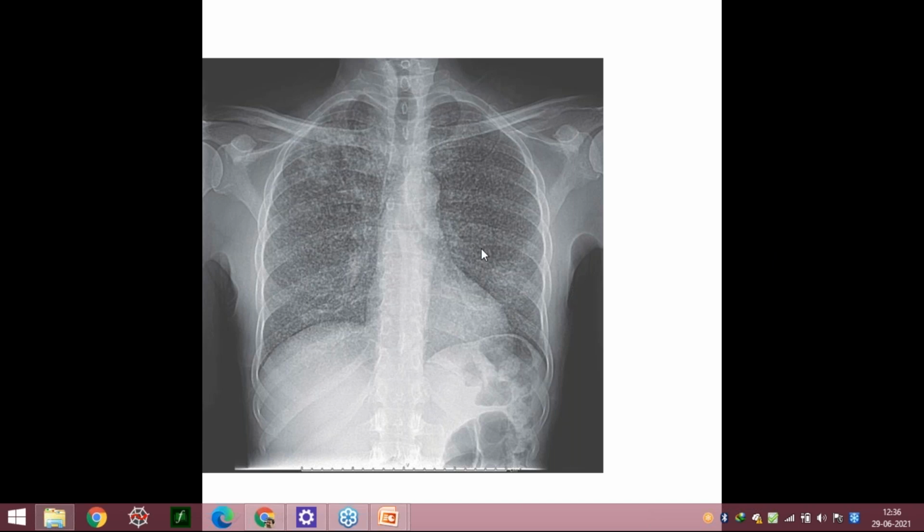If you're not able to tell this, then the viva won't go further, obviously. However, if you say that endemic mycosis is very unlikely, if we go further and I ask histoplasmosis, it will have slightly bigger lesions. Wherever you keep TB as a differential, obviously chronic fungal infections do become a differential. But this is a classical picture of miliary tuberculosis. However, you can confuse it, and another clinical condition can present like this as well and cannot be TB. Anything else apart from fungal infections?